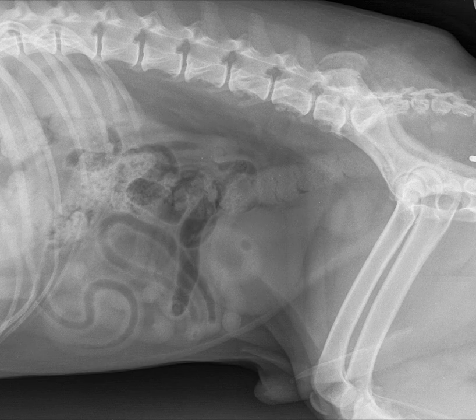I'm Heather. Today's example is an 8-year-old beagle with recent pelvic limb lameness and lethargy. Once you have reviewed the radiographs using your systematic approach, then you're ready to watch this video. To start, I'll simply show you that on the lateral view, you'll note caudal to the urinary bladder at the pelvic inlet, there's increased opacity in the region where we would expect prostate.